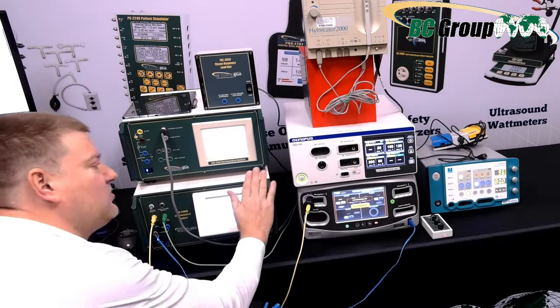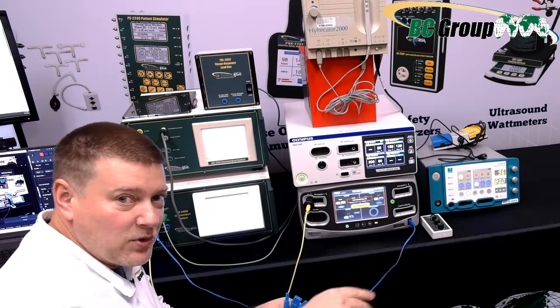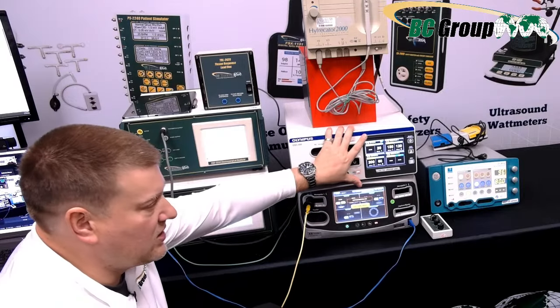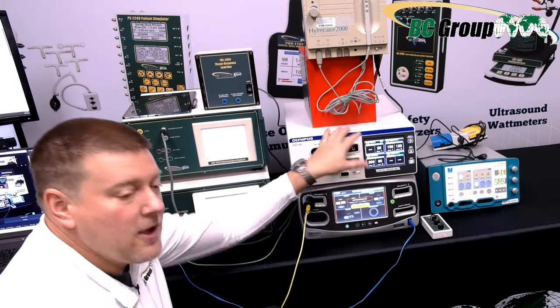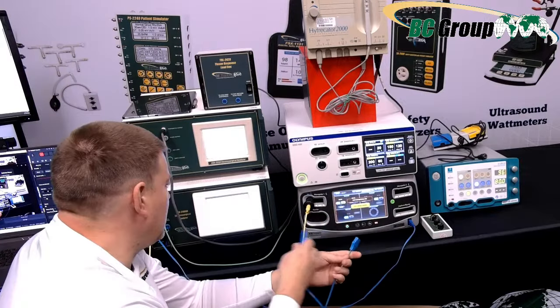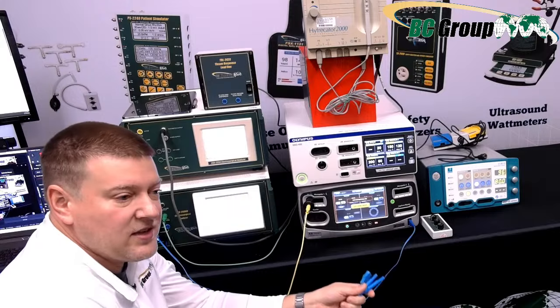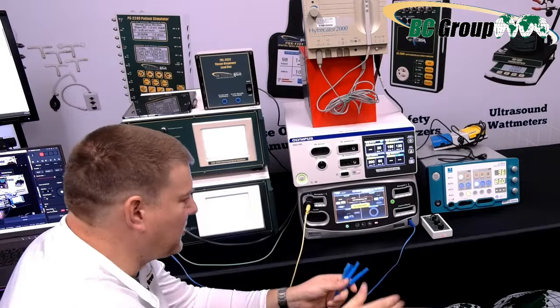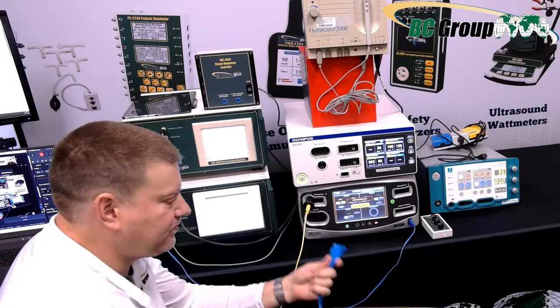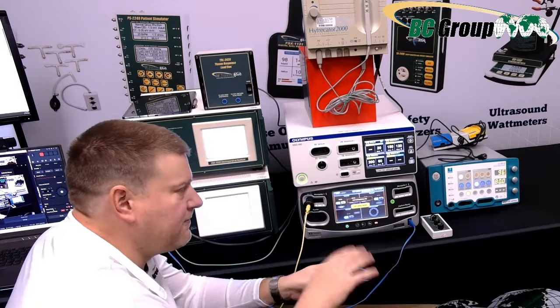And the cool thing is we can map that out on the ESU analyzer so you can see that curve, which I highly encourage people to do, especially if you have ESUs that are acting a little finicky. It's a performance test. You hook up this electrode right here to your ports, and you run a test where it maps out the curve, and it's so cool. We will probably run that one in just a moment. Anyway, this electrode right here is only required for monopolar.